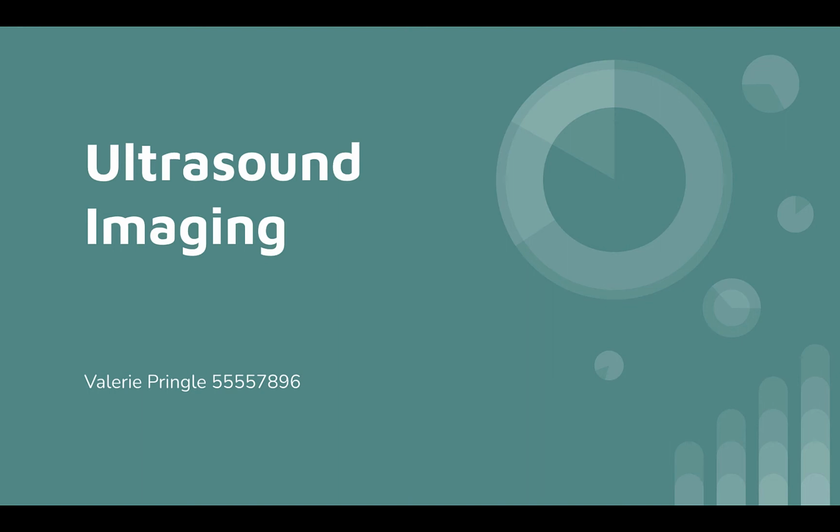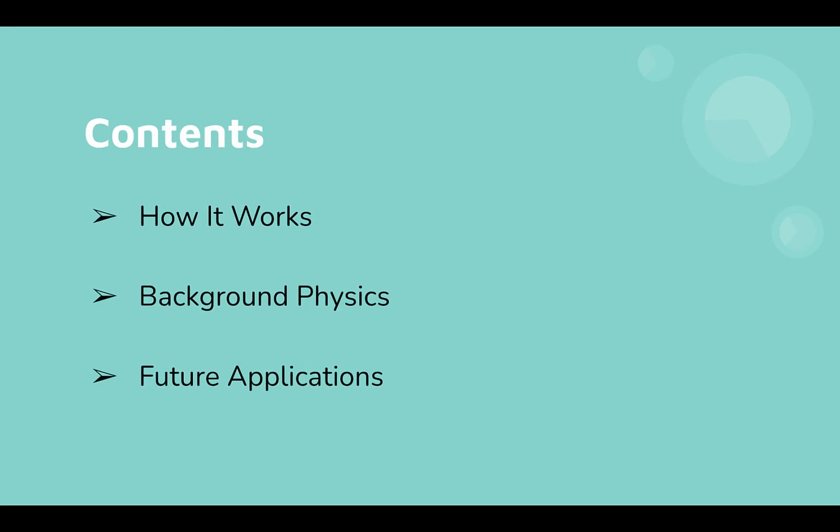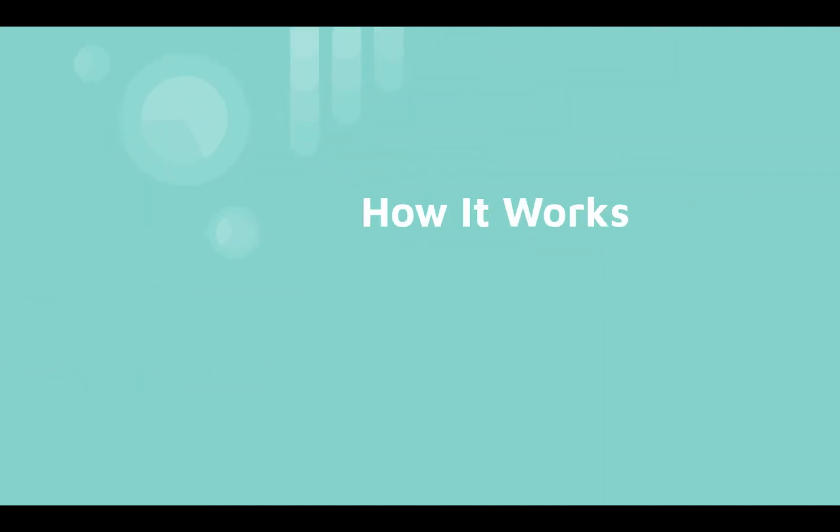Ultrasonography, also known as ultrasound imaging, is one of the most commonly used technologies for making medical diagnoses. This video will give a brief overview of how ultrasound technology works based on fundamental physical principles. First, let's take a look at the machine itself.